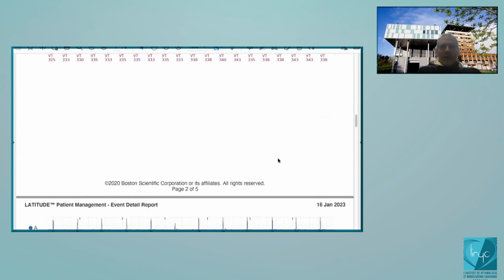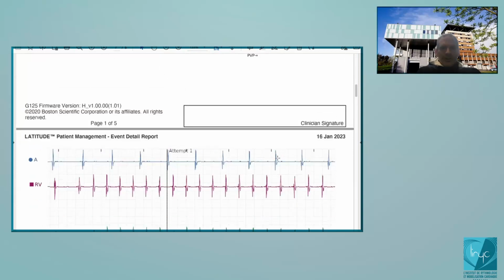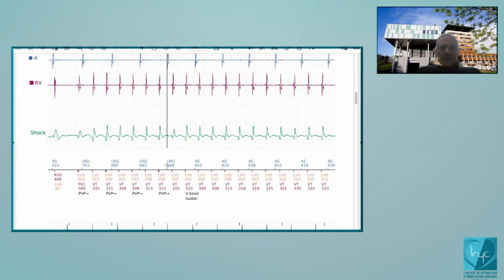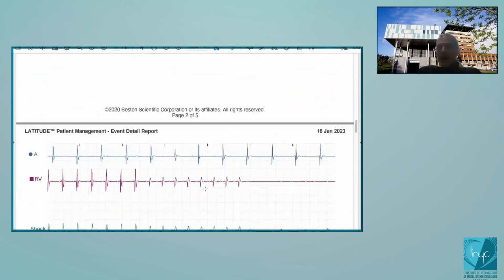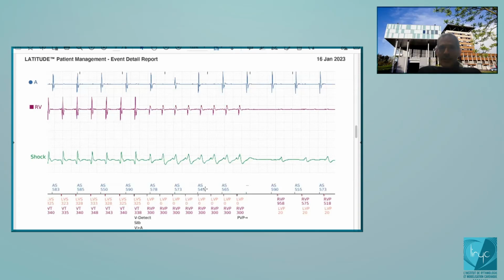So how long does it take now for this one? 8 out of 10, something like 2 seconds. And then you add the 12 seconds, at the end it's 14 seconds. Okay? You agree? The delivery of the ATP is after 14 seconds.